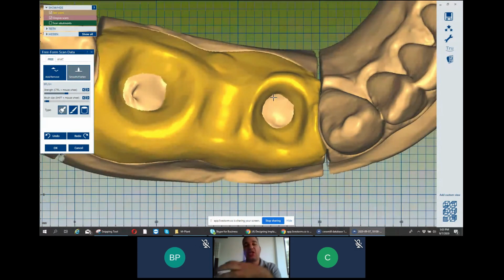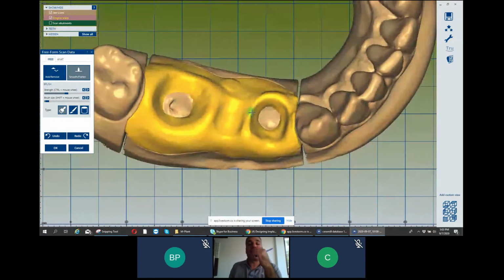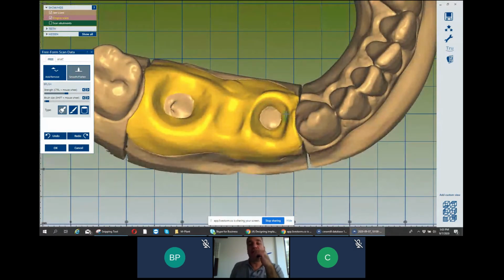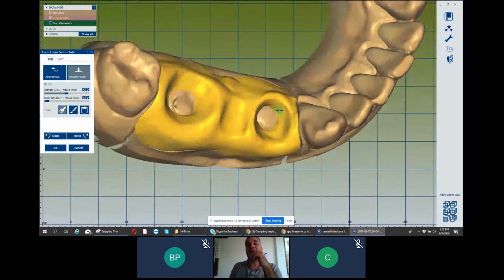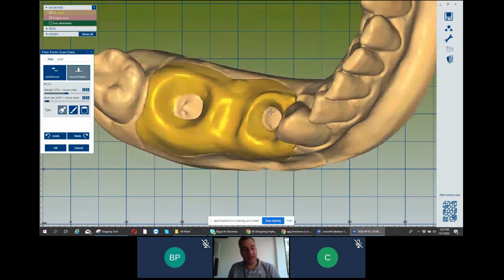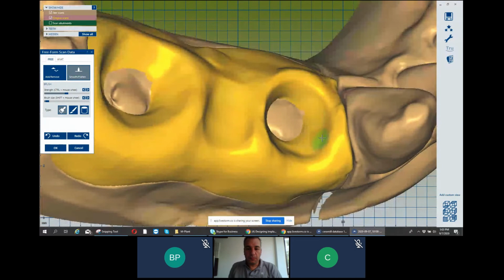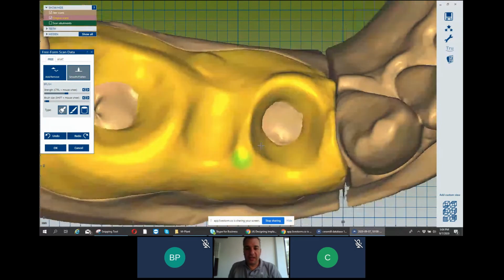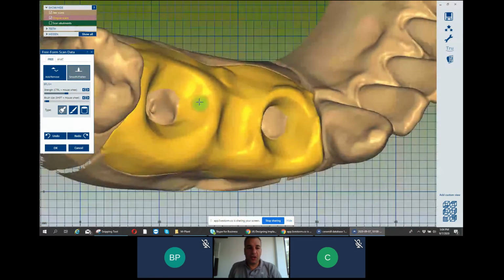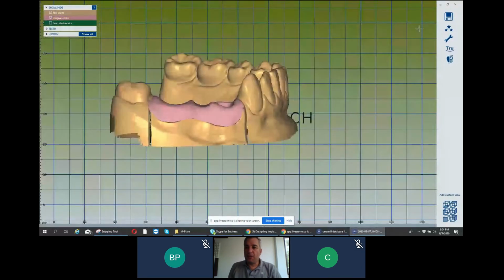So we don't have the shape of the gingiva. He will ask you to create the gingiva shape. So you can make it this way. You can prepare your gingiva design, and then you create the healing cap and you send it to the dentist. So you can repair your gingiva and start your work. As I said, it's a soft tissue. Don't worry if you play on it from this side. Finish.